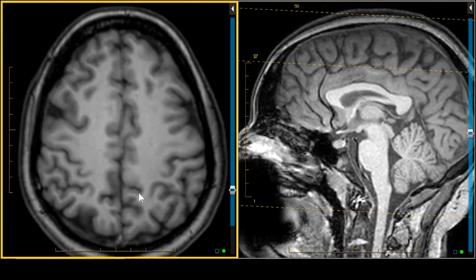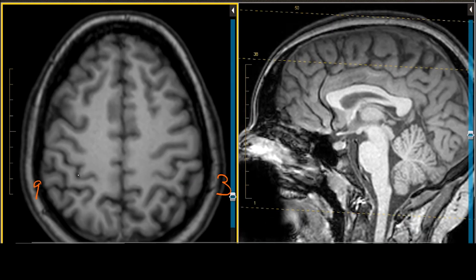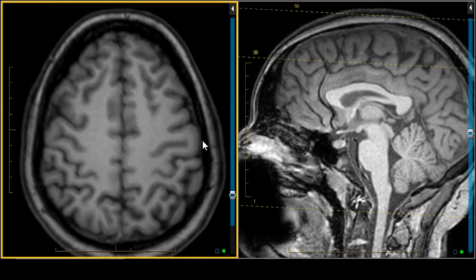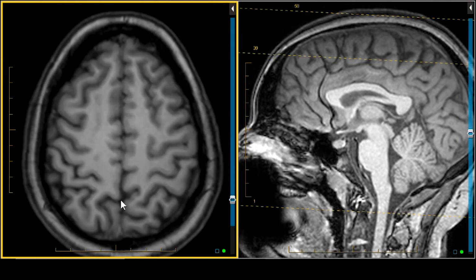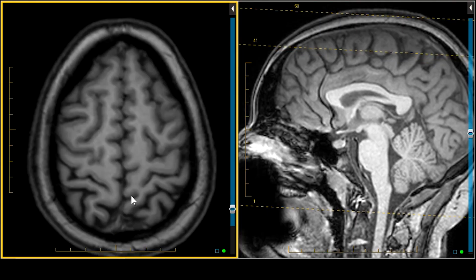Now let's look in the axial projection. Here we are down low in the pars marginalis, which is this ascending sulcal structure right here. We have our droopy mustache, and then as we go up, the mustache is a little bit straighter. It's also found at the widest biparietal diameter at the 9 o'clock, 3 o'clock position. Typically that is where you're going to see the pars marginalis, and there it is. Our mustache is getting a little bit straighter. Let's keep going more craniad, and now our mustache is kind of flipping up a little bit like Salvador Dali's mustache that's no longer drooping.